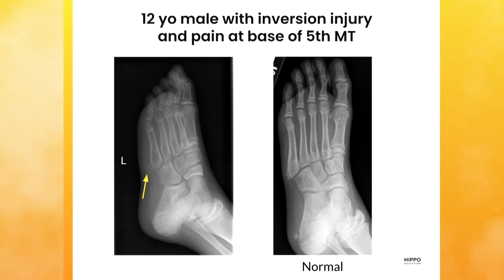And so that's an apophysis at the base of the 5th metatarsal, and we can see that normally. And the thing that you were asking is, what ages do we see this and that? I think it's really hard to know that for certain because some kids' bones mature later, some earlier, so you want to know a ballpark, but you give people some range and allow them to be a little ahead or below the curve.